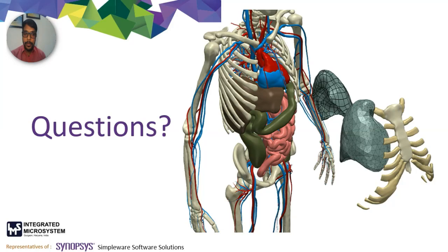The automated solution, based on machine learning and deep learning algorithms, takes around 2 to 3 minutes. Similarly, the knee segmentation takes around 2 minutes from the PD-weighted MRI scans. So right now there are these three sections for which machine learning algorithms are available.